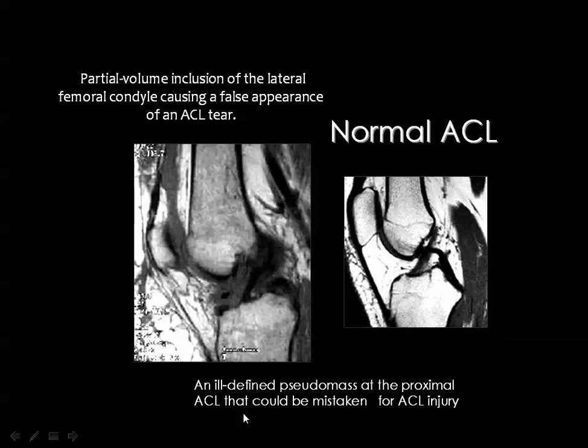If you look at this image, in this particular example you can see both the anterior and posterior cruciate ligaments appearing in the same section, but frequently the anterior is seen in a different image than the one where the posterior cruciate ligament can be identified. If you have selected the right angle of scanning, you will see the anterior cruciate ligament like this.